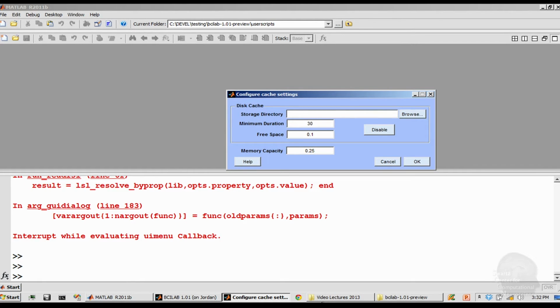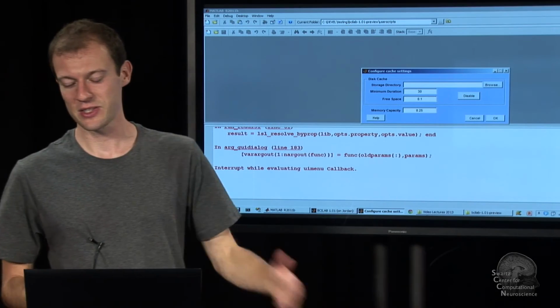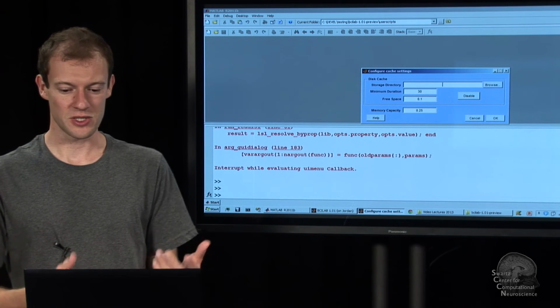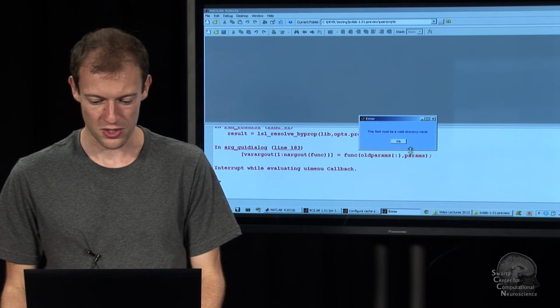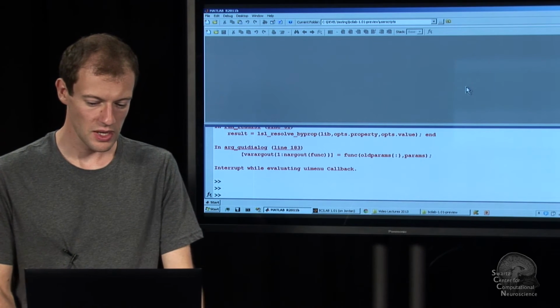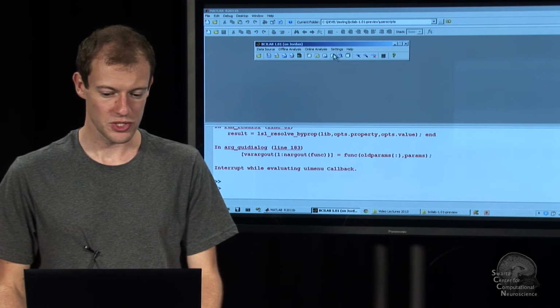So say, for example, you overwrite your original data on disk and expect your results to change if you rerun your whole pipeline. But if they were stored and cached, you suddenly get the same results again, and so on. So since there is more state involved and scattered over your disk, it can be counterintuitive unless you really are principled in how you work. And so that's basically most of the stuff that's in the GUI.